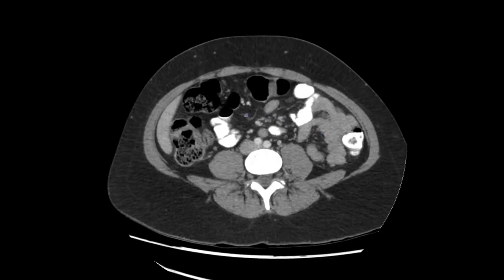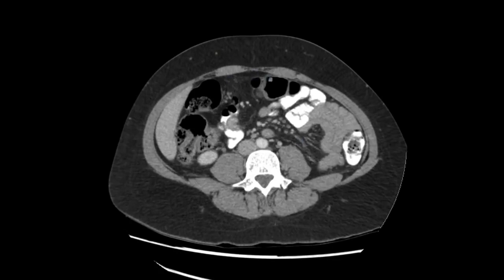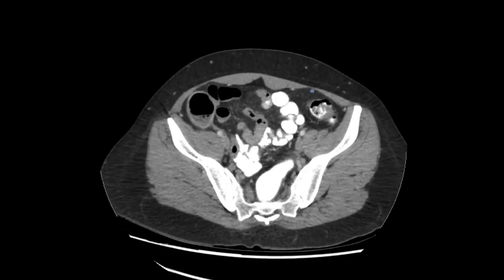This is the small bowel mesentery that we pointed out earlier. And anteriorly, we have the greater omentum, where we see fat attenuation and small vessels. In abnormal cases, like the case we showed earlier, you'll see soft tissue density here or other abnormalities in these peritoneal ligaments.